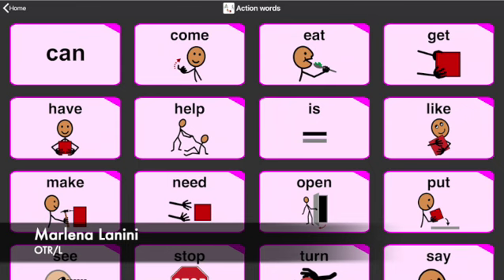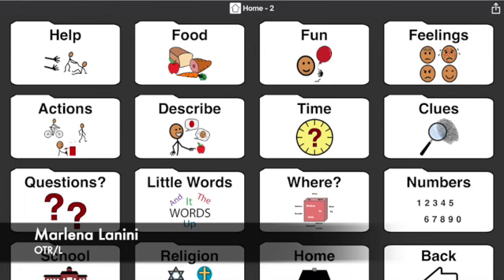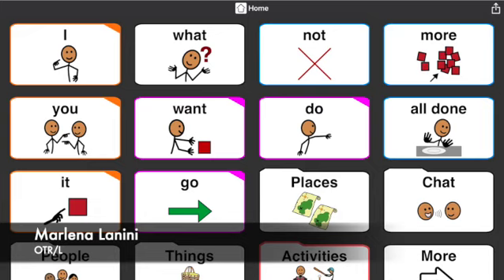So I need to find you, so I have to go back home. Little words can, go back. Say, and go back home for it. You can say it. I was still able to tell you that pretty complex sentence.